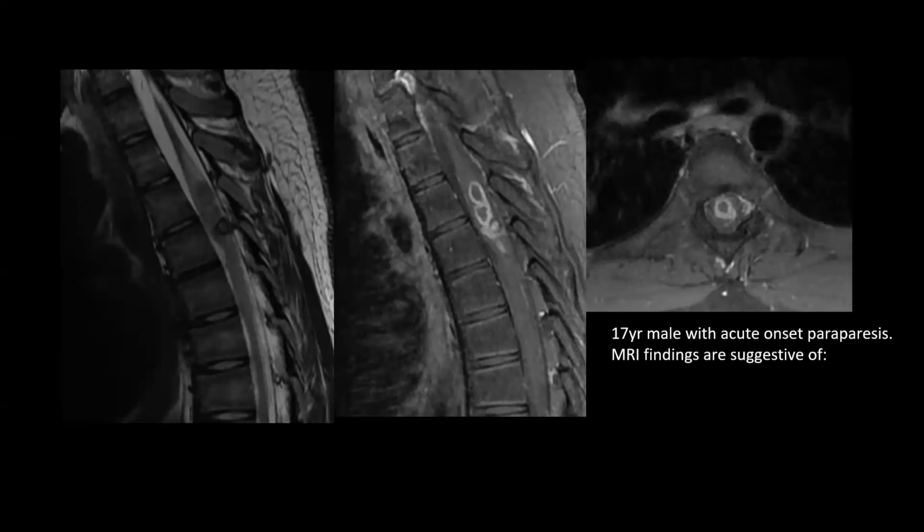What you are seeing is an intramedullary lesion, which is showing peripheral enhancement and a lot of perilesional edema. Now, the speciality about spinal cord lesions is that because the compartment as such is very small as compared to the brain parenchyma, even a smaller lesion can present with a disproportionate amount of perilesional edema. So here we are seeing these lesions, and whenever you're seeing such a spinal cord lesion, it will be good practice that you screen the brain as well for additional findings.